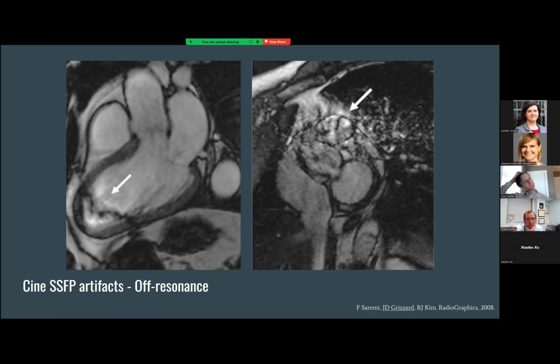So you have increased attention then to the potential to shim and maximize your main field, your B naught field homogeneity. So what we can do if minimizing the TR doesn't move the artifact is that we could potentially do a volume shim centered around the left ventricle, and we can ask the patient to breathe shallowly so that the chest motion is minimized as well.